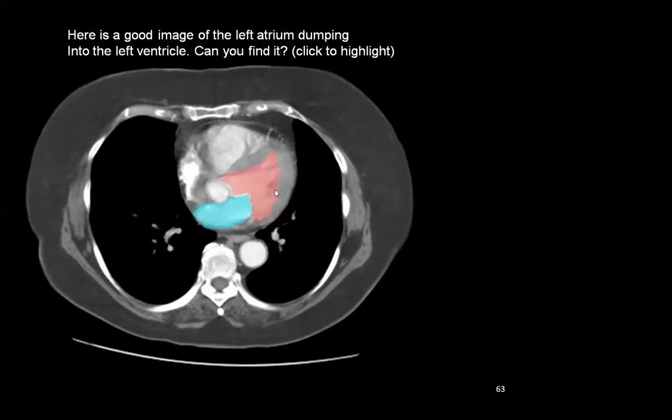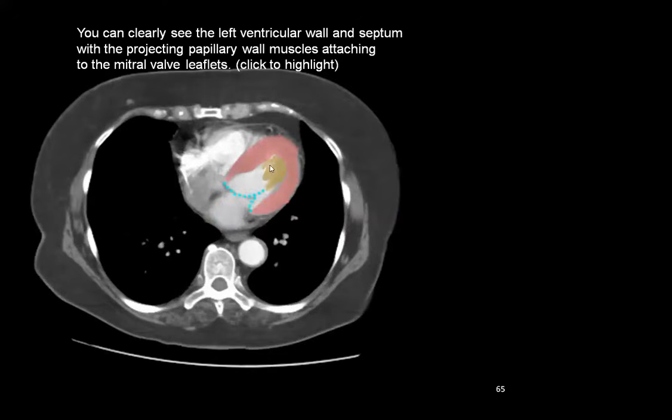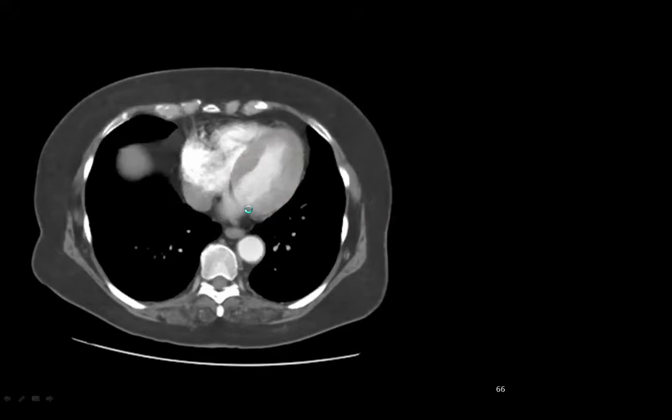This is the left ventricle, this is the interventricular septum, and this is the right ventricle. Posterior is the left atrium, and this is the thick muscular wall of the heart.